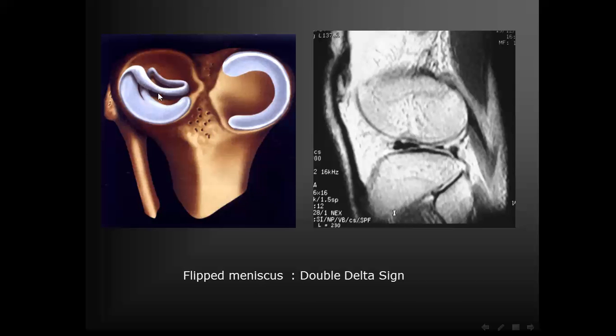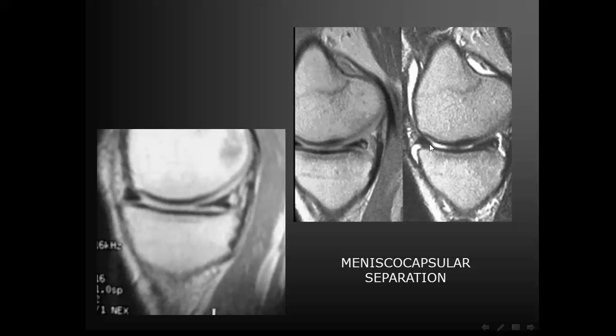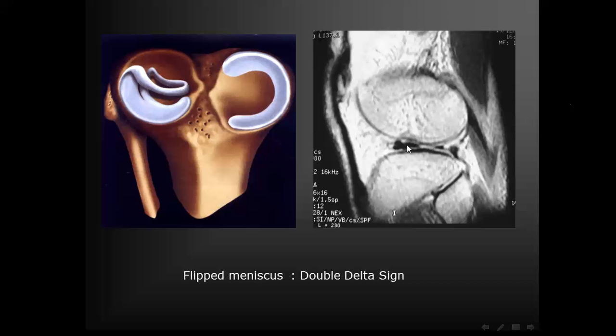This is a flipped meniscus. That means it is removed from its side and then turned back like a U-shape, and thus you can find two menisci at the same time in the sagittal. This appearance, with constriction, is no longer triangular. It's a flipped meniscus.